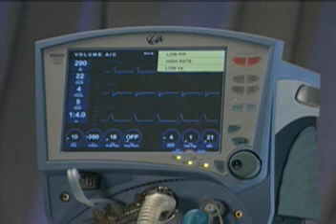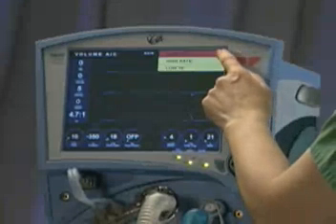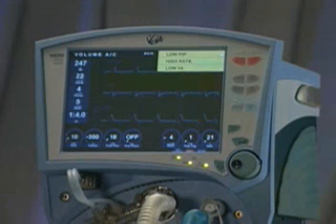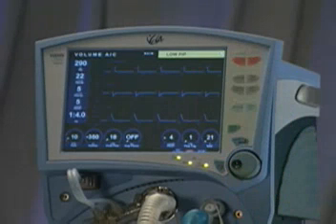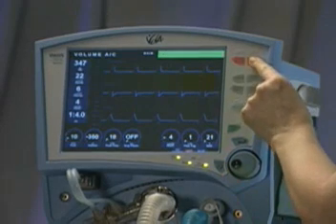The highest priority alarm is always displayed in the top alarm position. A drop-down display makes viewing multiple alarm messages possible. Touch the white triangle that appears on the right-hand side of the alarm status indicator. To close this display, touch the white triangle again. Once all active alarms have been resolved, the Alarm Reset button clears the display and returns the indicator to green.